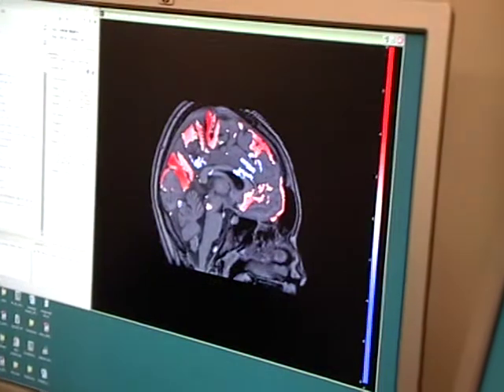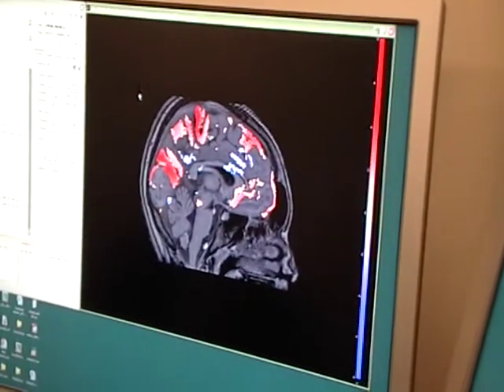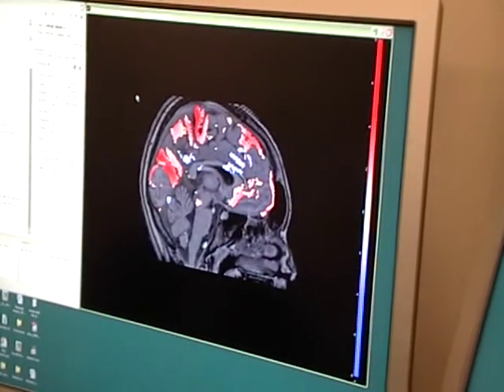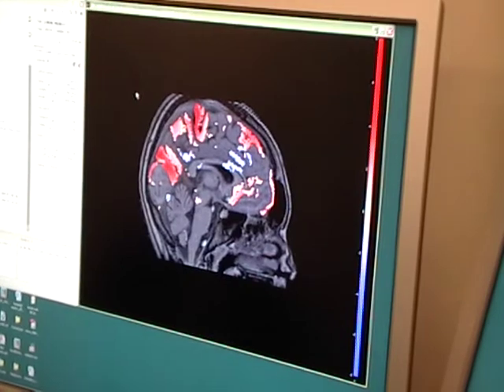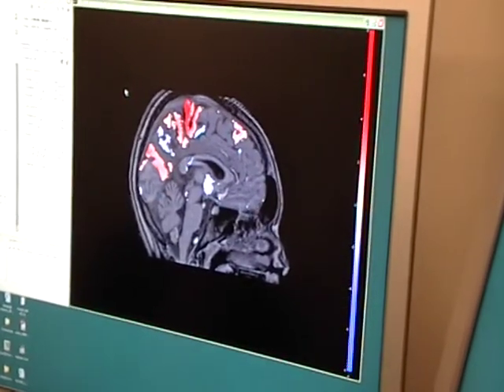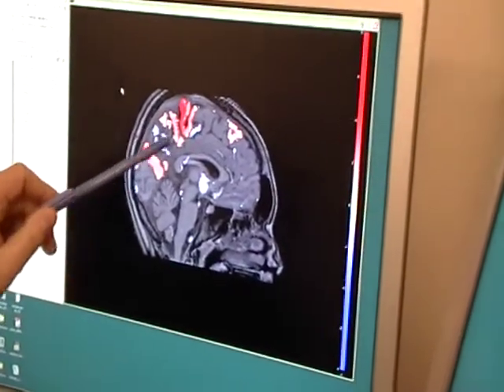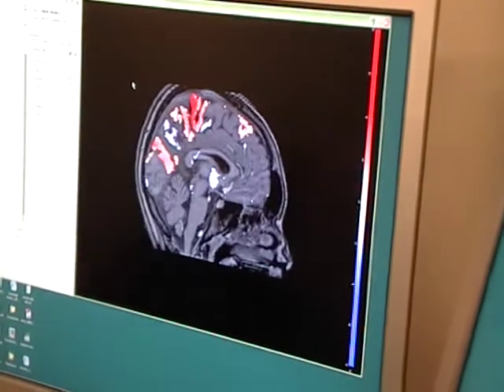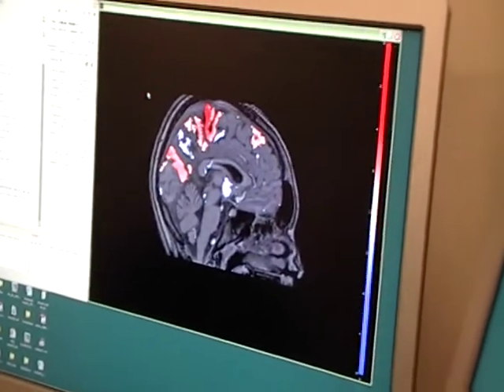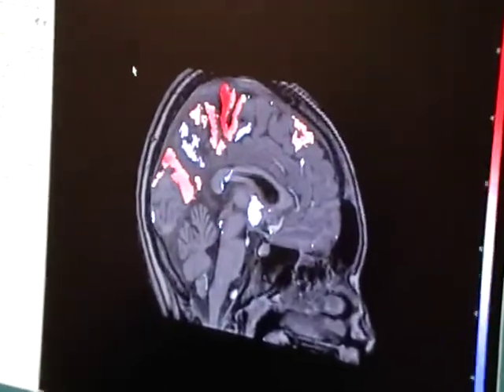normal brain activity. So the good thing with the MEG is that we have time on our side. We have time resolution that is very accurate. So every half a millisecond we have an image that basically shows us what's the activity in the brain. So again, in red we see the response to the sensory motor stimulation, where we try to map basically the healthy part of the patient's brain that we should not remove after surgery.